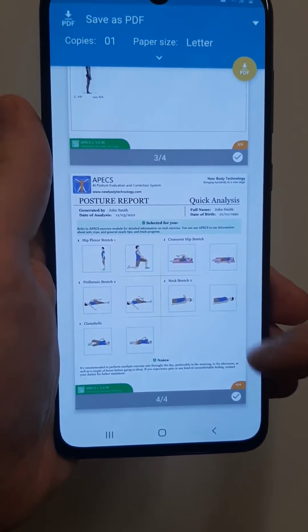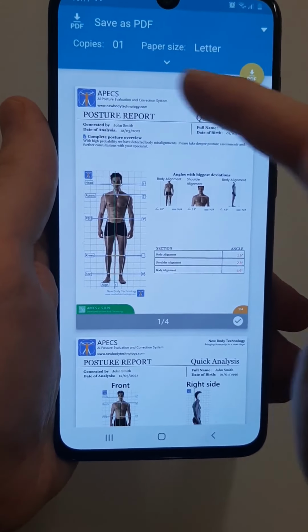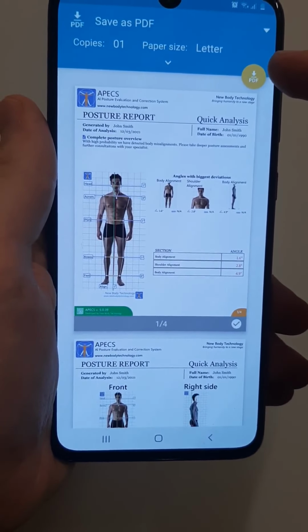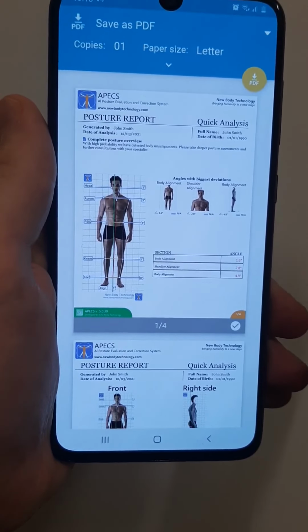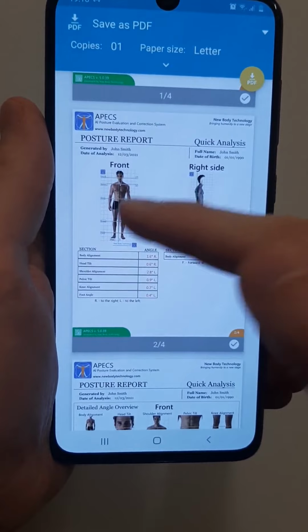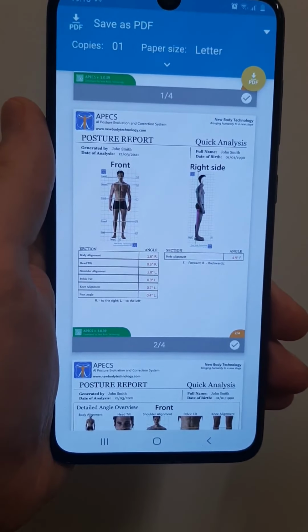Now, as you know, you can edit and customize the header in the PDF report customization, so you can put your own banner, you can put your own contacts. Don't forget that you have now to save this report. To do that, you have to click on Save PDF, or here, Save as PDF. If you don't save the report, it will be lost to protect your data. And you will only have these general JPEG images that will be saved in the results folder on your main menu.